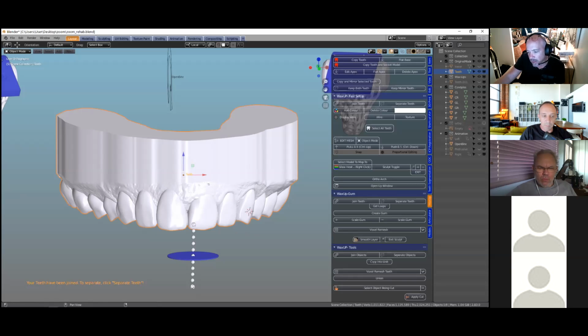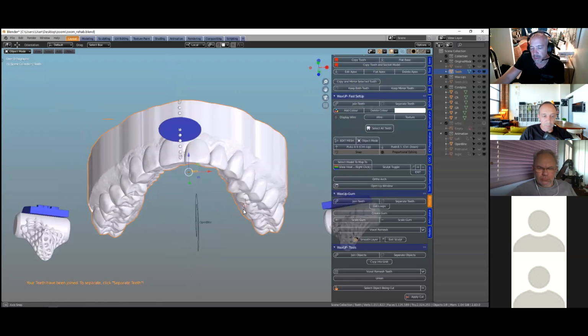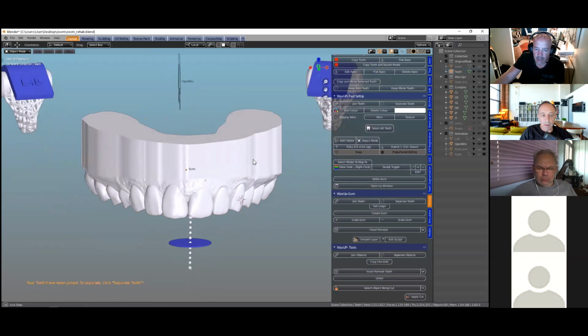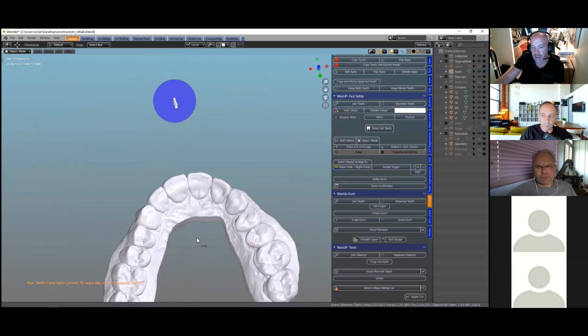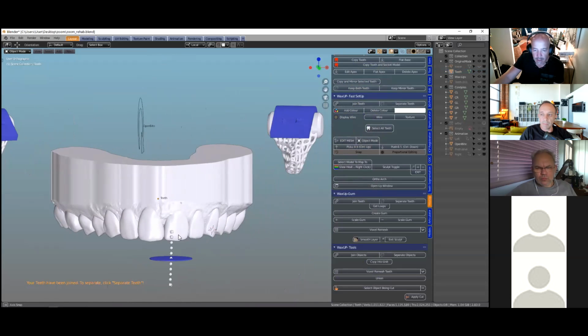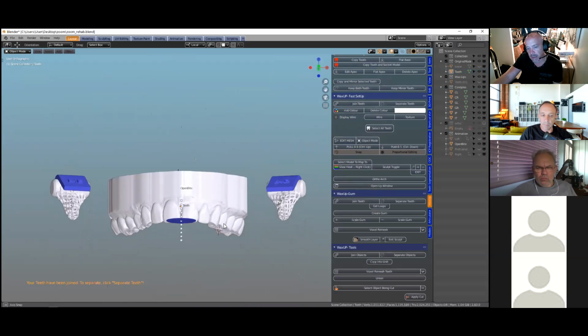And then you would join this to this specific one with a union. All right, I'll just try that union. And then you take the splint module, cover this with a splint, and then be able to make temporary shells. Actually, we could have brought that up a little bit more, but I think it's a basic idea.